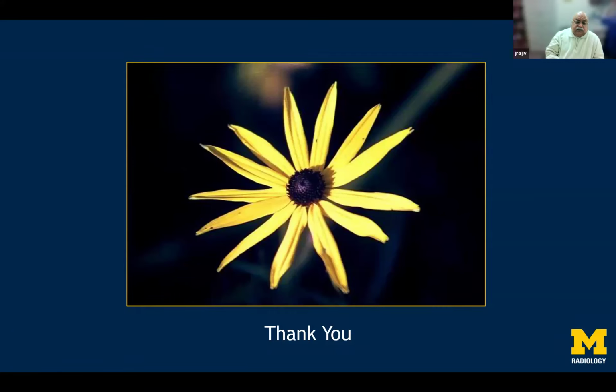And remember that depending upon the extent of disease and also the anatomy which the surgeon will encounter, that will determine the opening of the maxillary antrostomy as well. So I think that comes with expertise. Right. Thank you.